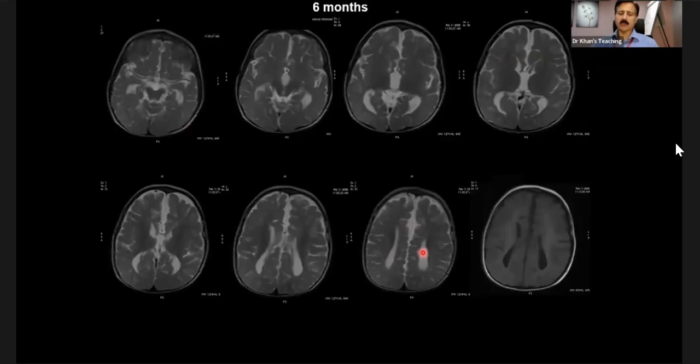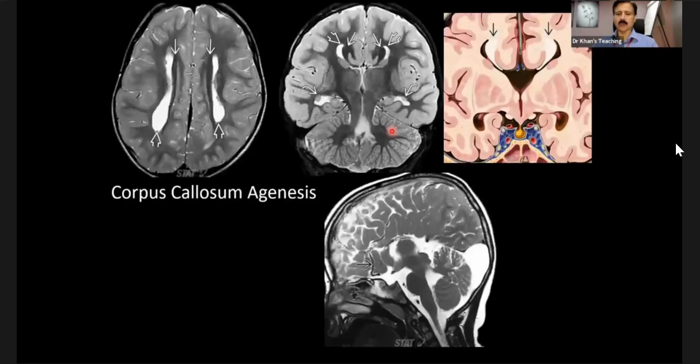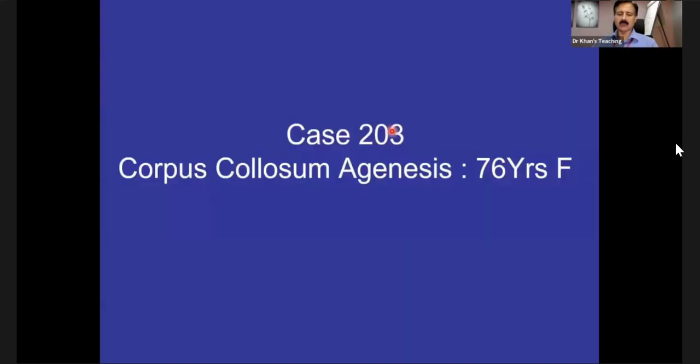With that, please remember that there is a concept of colpocephaly, where the occipital horns, because of the orientation of white matter tracts adjacent to them, also appear dilated. So this is the same spectrum. The third ventricle has moved superiorly. So this is corpus callosum agenesis.